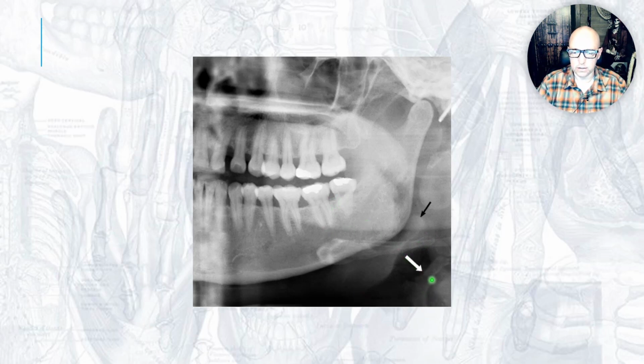As you can see, this is something else altogether, something that you're not always going to see, but it's not terribly uncommon. This is a calcification of a certain type of cartilage. So what cartilage is below the hyoid bone? The thyroid cartilage. And so that's the superior cornu, or superior horn, of the thyroid. And it looks like even more, a little bit of calcification here. Anywhere along that membrane you can get calcification. You have your thyrohyoid membrane, but especially along the posterior border, you get the horns.